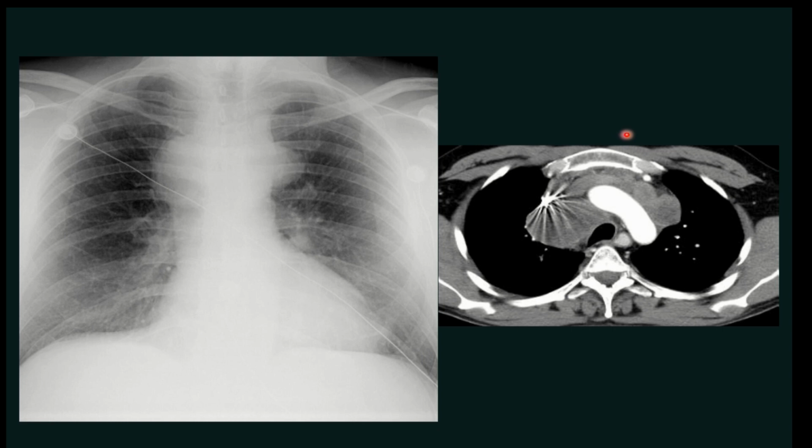So whenever you see an opacity, and the upper margin of the opacity is limited by the clavicles, that usually says, not always, usually says that the lesion is located in the anterior mediastinum. Okay, so you can see here a lot of right paratracheal nodes and anterior mediastinal nodes. So on this sign, you can see the upper margin of the opacity is not crossing the level of the clavicles. Hence, we can confidently say that this is an anterior mediastinal lesion, and we need to confirm it, of course, on higher modalities like CT.